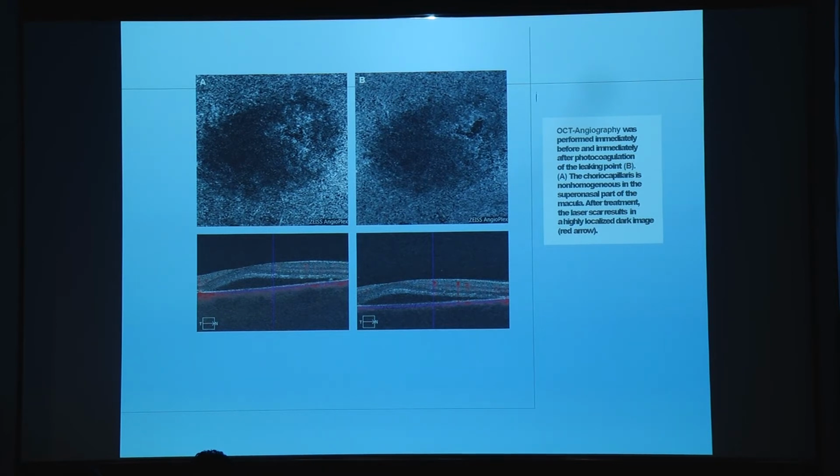So such cases will also have a useful implication of OCTA being performed, especially in patients who have recurrent development of subretinal fluid in spite of doing an FFA, focal laser, and controlling the risk factors. So we should suspect neovascularization in certain cases.